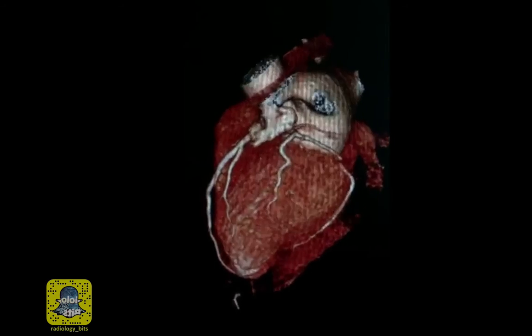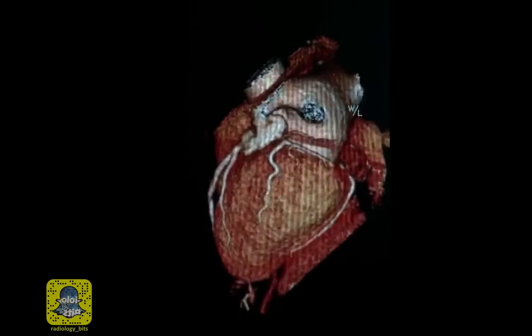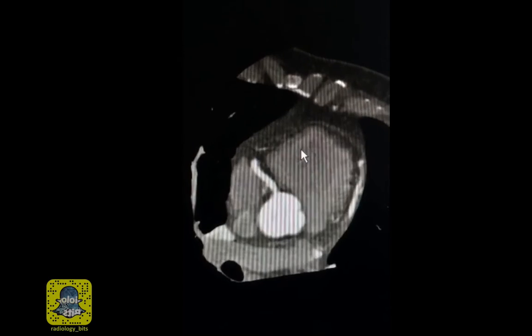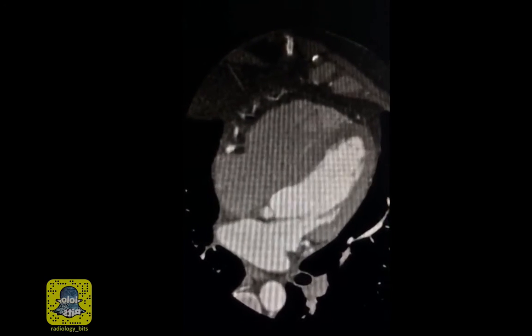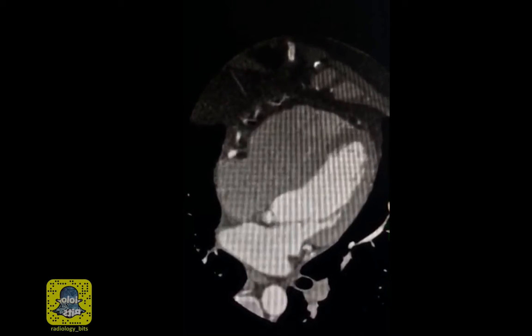You could even look at more exciting stuff by performing 3D imaging of the heart and removing or putting on layers. Looking at all these different reformats, you could tell how powerful this modality is. One of the things that I need you to know is that this is called a cardiac CT, where you could look at different structures.